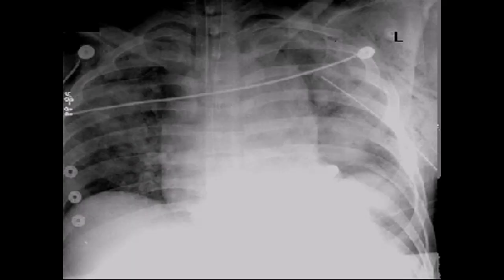So what does that look like? Well, let's take a look here and see what we can find. First, we have rib fractures. Next, we take a look at the mediastinum and look at how wide that mediastinum is. And we notice that we've obliterated the aortic knob. We can't see it as well. It's sort of blended in. Also, notice how we have the trachea being pushed over to the side, over to the right. It's a tracheal deviation to the right.